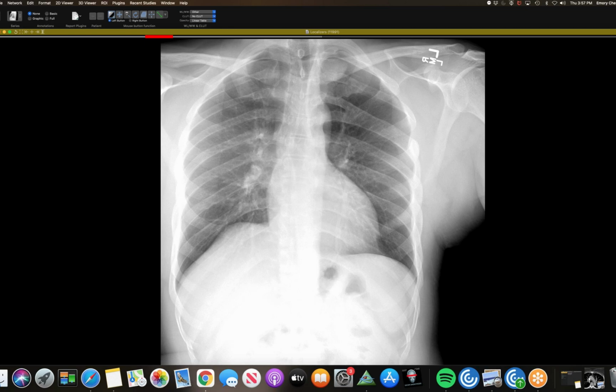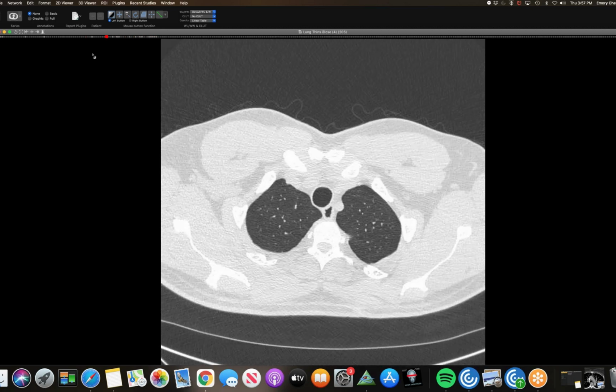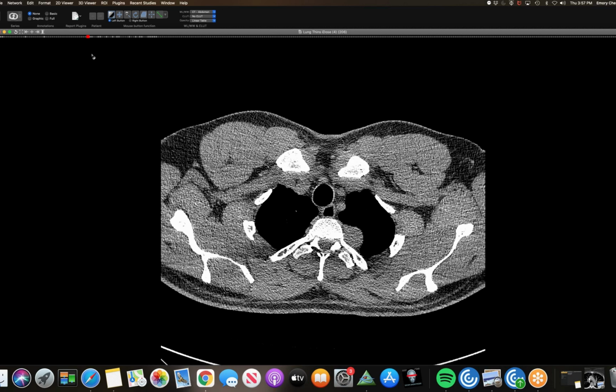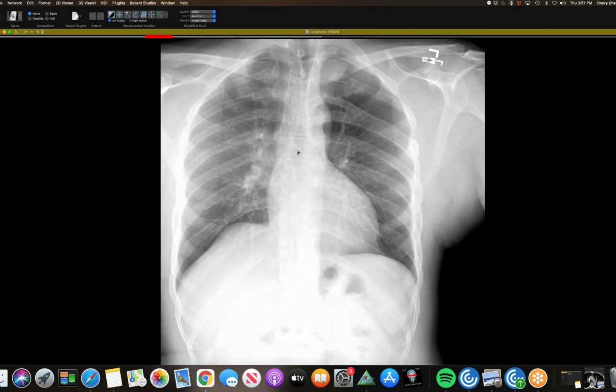Neurofibromatosis, guys? Yeah, that's what I was thinking. Very close, but it's posterior mediastinal. Little schwannoma or something. Yeah, exactly. Good one. Is it a lateral? Can you see it? It's probably too high.